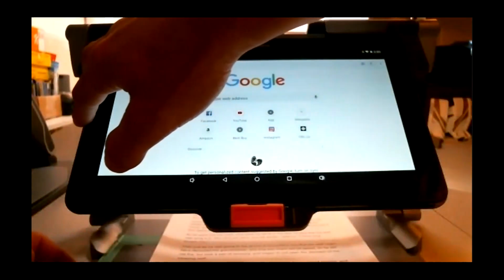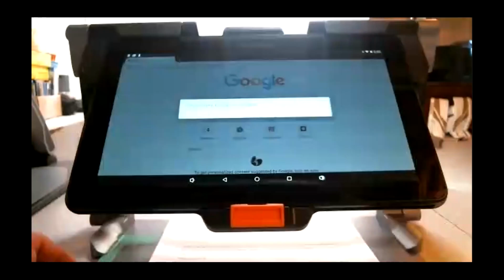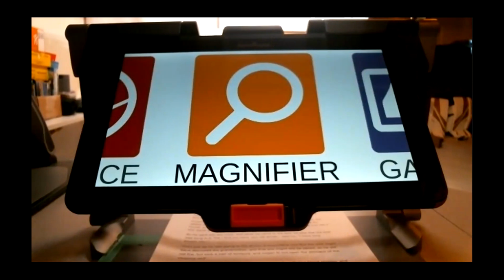So I go to my Chrome. So again, this is the thing: I want to show you stuff that is coming. Sometimes it doesn't work completely, but the guys are still working on it. I want you to get excited about the new version that's coming very soon. We aimed it at September, but we couldn't. As you can see, there's still bugs in it.